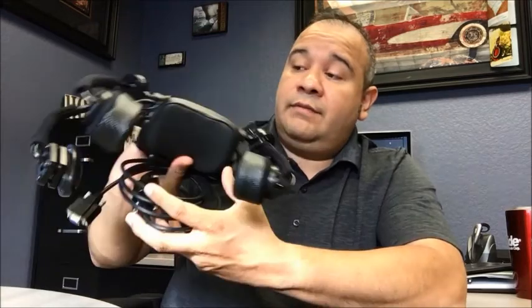So why don't we begin? This is the actual iDrive that I'm going to be connecting to. You've seen some previous videos where I do not need a power wheelchair to do programming with the iDrive. We offer power banks, battery powered systems that will allow your head array or any kind of driver control to be on or active in a manual chair situation, or even a bedside situation. So whatever type of assessment or evaluation you need to do, you're able to do it with iDrive.